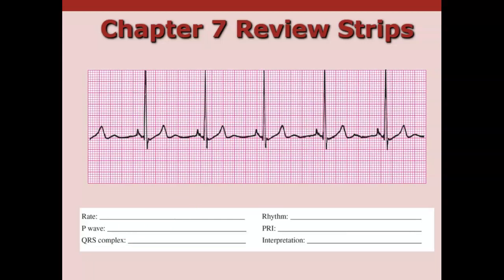Now, can you guess what we're probably going to look at now? Yes, you were right. Sinus, maybe Brady. Let's take a look. 1, 2, 3, 4, 5. A heart rate of 50. Rhythm. Make your marks here, or like I said before, we can count your boxes. 3, 4, 5, and some. 1, 2, 3, 4, 5, and then part of a box as well. Looks pretty regular. Remember, 0.06, I believe, is the difference before it takes it into an irregular rhythm.